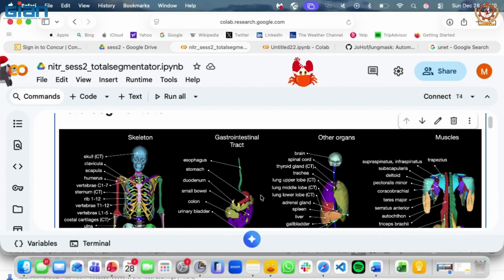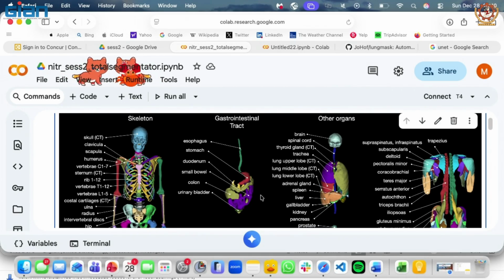So basically, everything that you want. As bioinformaticians, or medical technologists, or whatever you like to call yourselves, it starts with segmentation, as I kept saying, and whatever organs you might want to work with, which is solid organs, like of course blood segmentation. I'm pretty sure that's not a thing, but for any organ that you want to segment, TotalSegmentator does that on CTs, and I think since last year or the last few months also on MRIs.